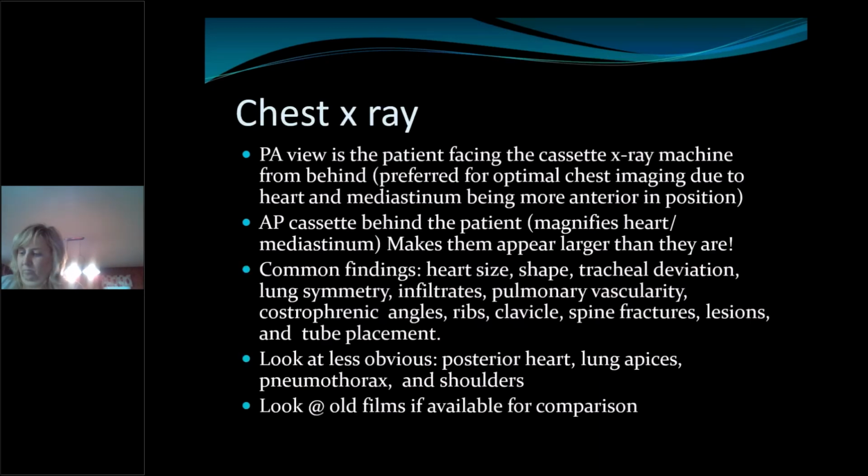So when we look at the chest x-rays, remember I mentioned PA versus AP.